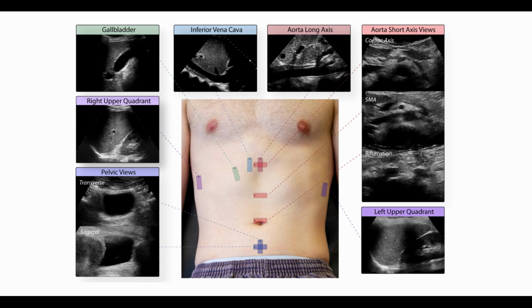Although the abdominal aorta is not strictly part of the FUSIC or FAMOUS curriculum, it is an important abdominal landmark and a potentially crucial cause of hypotension in a patient with undifferentiated shock. The inferior vena cava lies to the right-hand side of the abdominal aorta and is frequently assessed as part of an echo study and so will not be discussed here.